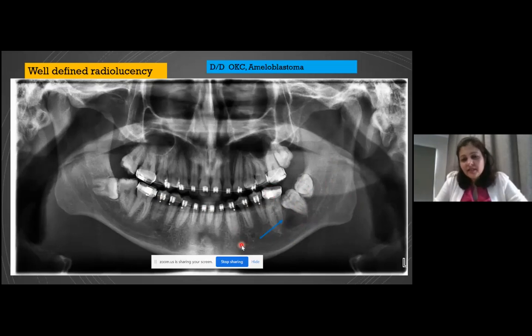So that means when the orthodontic treatment first started and the patient was screened, this lesion was either missed or it has grown rapidly within the time frame of probably the 1 year that the patient has worn the braces. So that is something very important to note. It's critical to screen the patient with a panoramic radiograph before applying braces or any treatment.